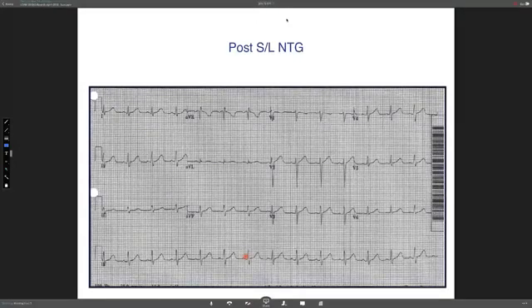As long as there's no other evidence of pre-excitation, a short PR interval is a benign condition. In the past, I think they used to label it LGL syndrome, which may simply indicate the patient has a fast pathway, and if the patient also has a slow pathway, they're more prone to have some sort of AV node reentry tachycardia. But it doesn't mean much. This would be my interpretation. Do you have comments, Khalid or Yousef, about the short PR interval? I think there's another question.